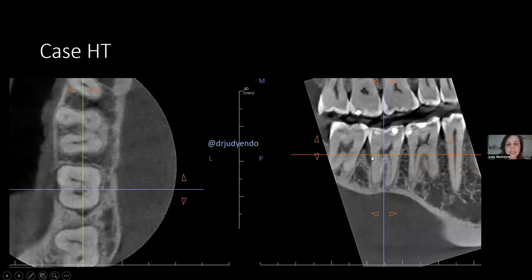Again, ideal is about 20% down of the root length or less, in my opinion. That's according to me, my opinion. So again, bone, bone, bone, Mickey Mouse ear, and that corresponds to that right here on the angular defect.